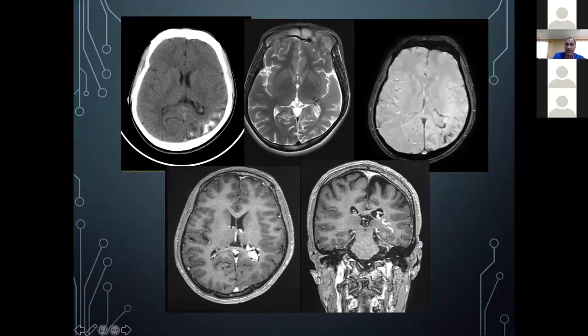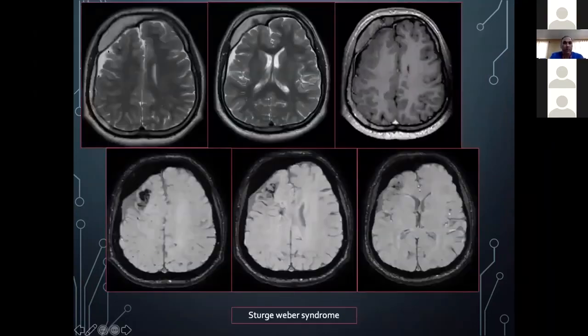This leptomeningeal enhancement may not always be present, so don't think it's mandatory to diagnose it. And there can be overlying bone changes. For example, it can get thickened. There's a focal atrophy here. Again, there's some amount of calcification here, and not much enhancement actually.